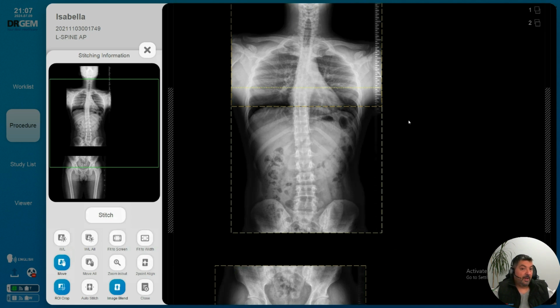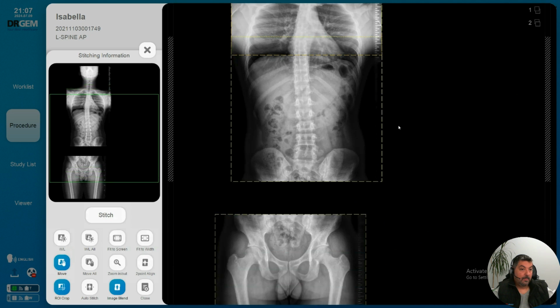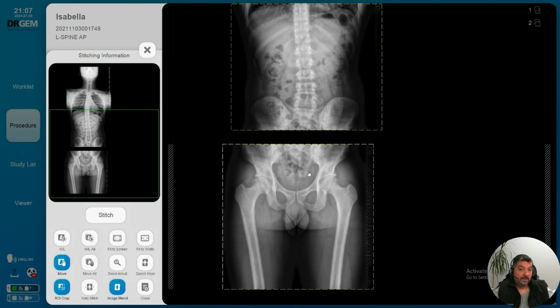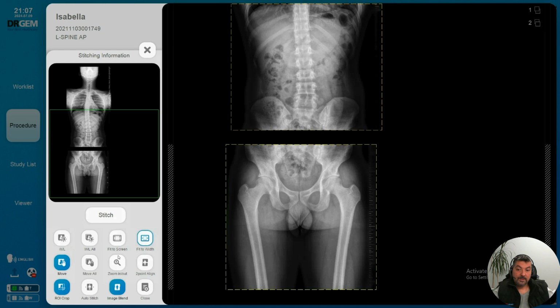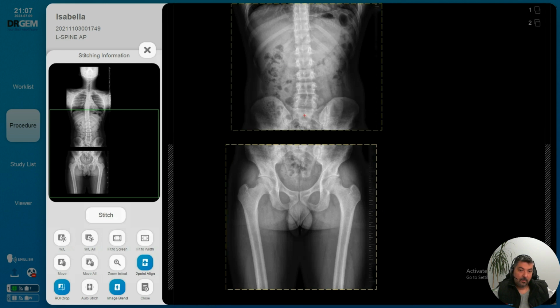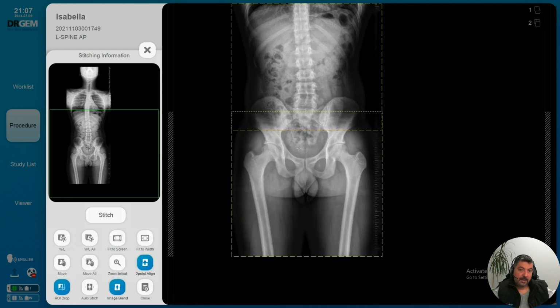If you've got a scroll on your mouse button, you can scroll down so you can see the next lot of images. And in this one, we're going to use that 2-point align again. So we'll click on that. We've got our top image now becomes our reference point. So I'm going to use this straight bang in the middle there, and that would align with this right here.